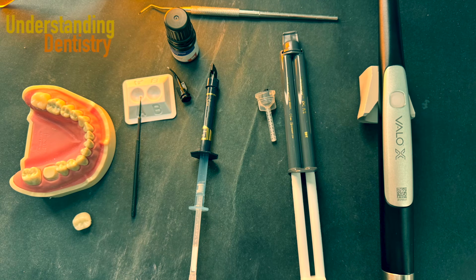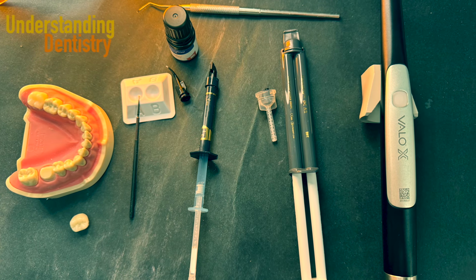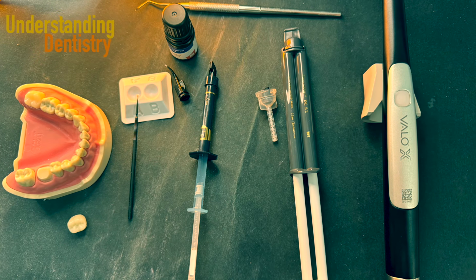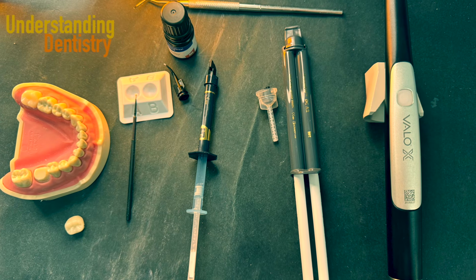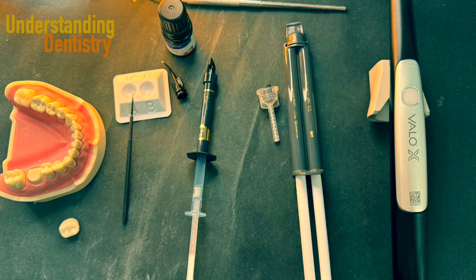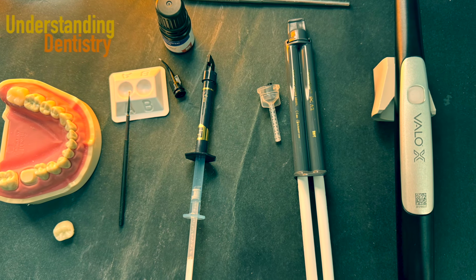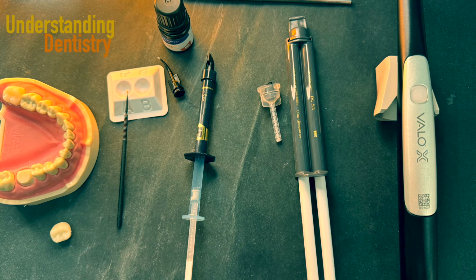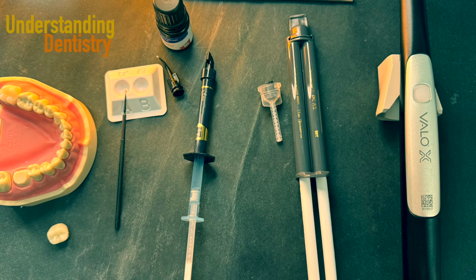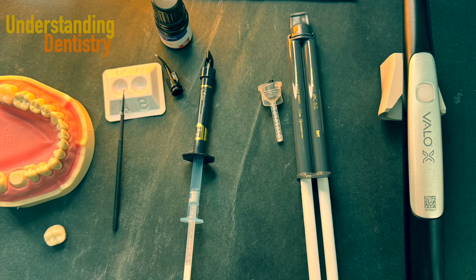And then for definitive cementation, we need a little bit more materials. You have the primer, you have the bond, okay? So you have the definitive cement, of course, and there are several materials. And then you have the light curing device, the Valo-X, that you guys are seeing on the right, okay? So I'm explaining from left to right. Okay, this is very important. We have also the video showing this procedure to you guys.